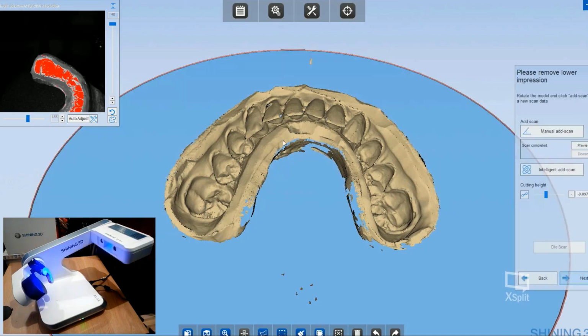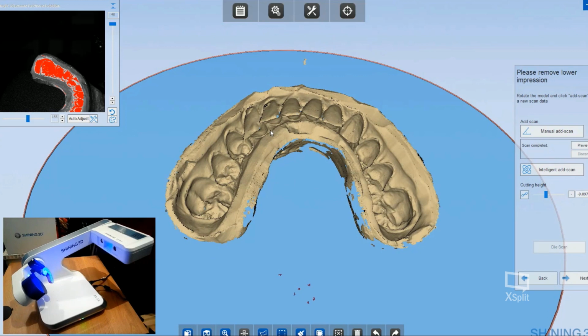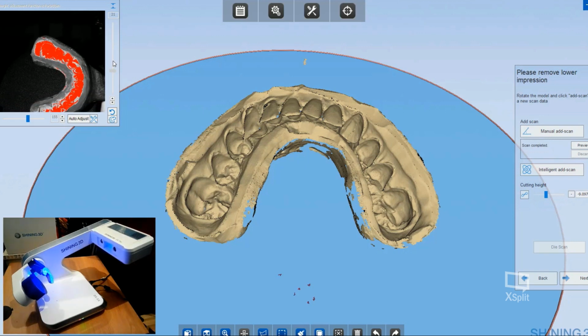I told you default because it's possible to customize the acquisition cycles, adding further acquisition just on the region where I need to add data. There are two ways of doing it, but before, let me set the exposure again.